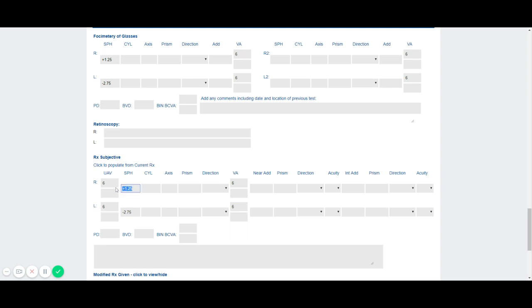If I entered some incorrect data, for example, it will highlight the text in red, and it won't allow me to save that now until I correct it.